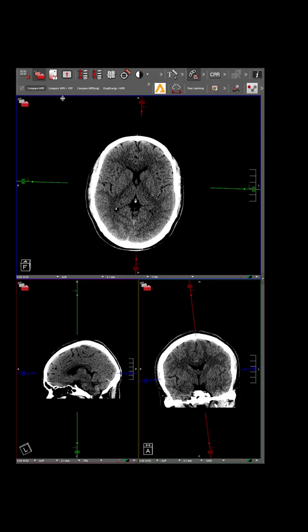But regardless, this set of tools, especially the setting as default, make layout the only default, and then saving that is the most important thing, because that's going to save you the most clicks.